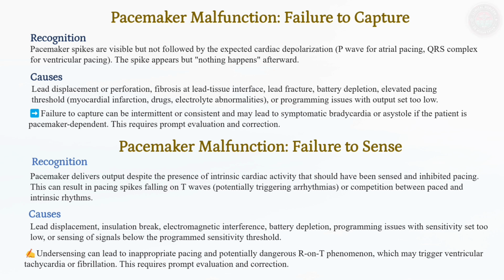This can be caused by lead displacement, fibrosis at the lead tissue interface, battery depletion, or increased pacing threshold due to metabolic disturbances. If not promptly recognized, failure to capture may lead to severe bradycardia or asystole in pacemaker-dependent patients.